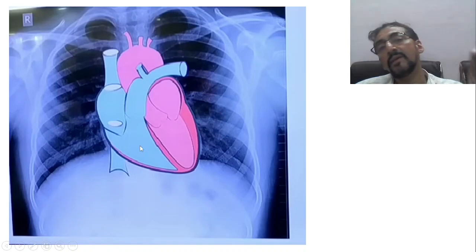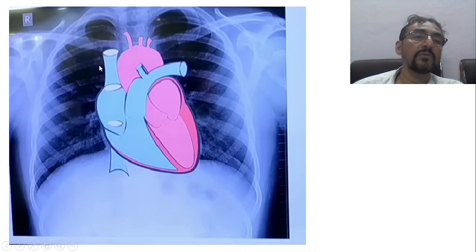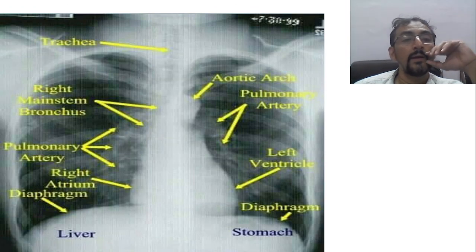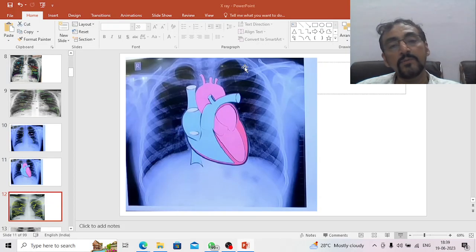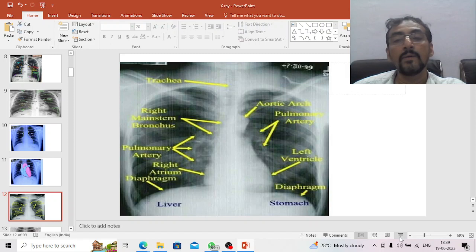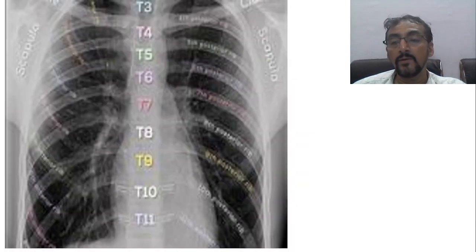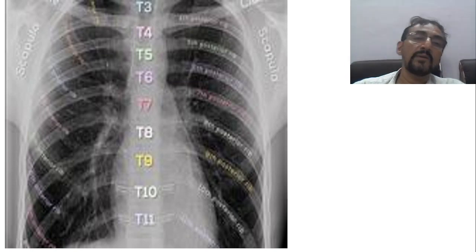Okay, so I think now there should not be any confusion. Now see other point, this is clavicle and all. Okay, now if you want one more picture, again we will have, I think by this time you are very very clear, there is no need of many more pictures. Now if you look into this portion, this is about the spine. Now spine जो है बीच में रहना बहुत important है. When you take the X-ray, spine बीच में रहना चाहिए.